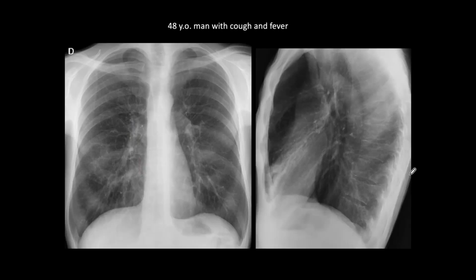Again, another case. I'm showing this case, as I showed you the case before, because up to now we have been talking about the anterior clear space. But the anterior clear space finishes more or less in the middle of the space. This one is a very large one, but it usually finishes in the middle. That's the lower part of the anterior clear space, and the lower part is occupied by the heart. When we look at the heart, we have to look at superimposed opacities over the heart, as we saw in the previous case with the nodule.